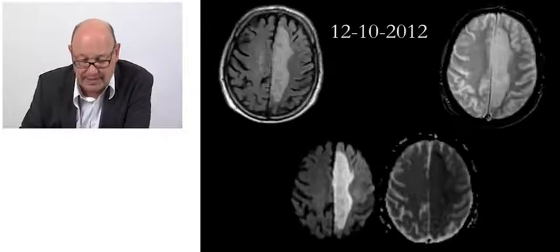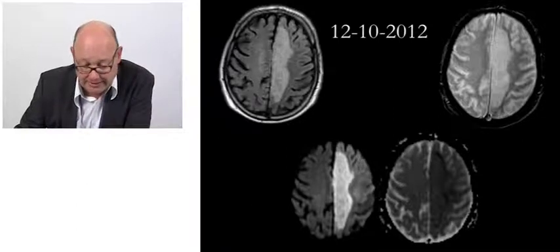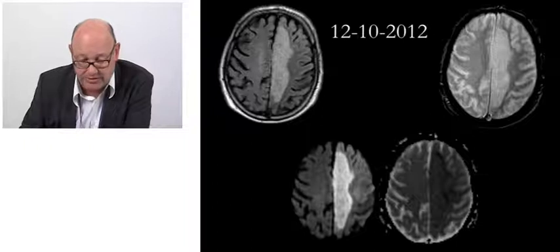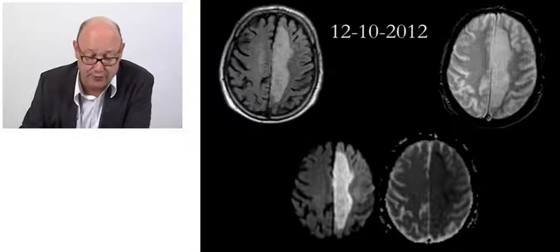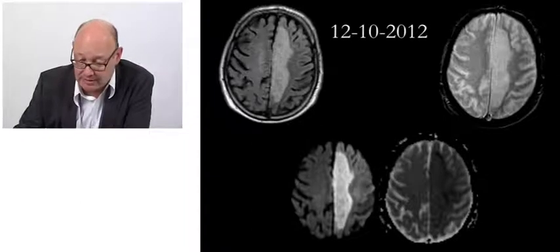Nothing special to remark on this image. Some days later, 3 days later, you see that in the same area there's a hypodense region, and this region is the distribution of the anterior cerebral artery. And if you do MR in the same patient, this is FLAIR, this is gradient echo, T2 star weighted imaging. You see there is no hemorrhagic transformation of the infarction.